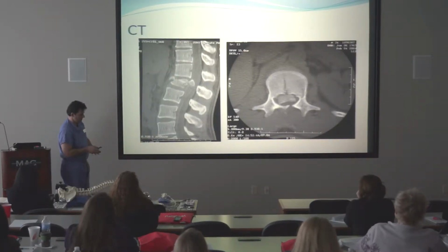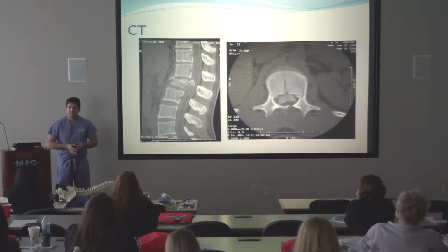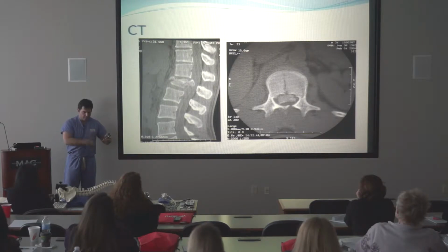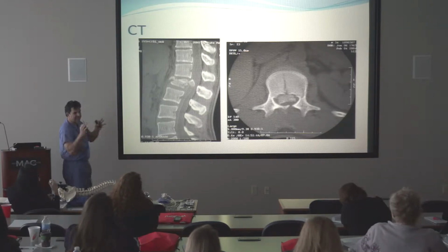Here's a CT scan. And then in addition to that, part I forgot to tell you is it works like a bread slicer. So there's vertical slices it's taking through you and then horizontal slices through you so you can get better details as far as looking at those fine cuts. So now you can clearly see the bones very, very clear. They're not this hazy whitish fog that you see on an x-ray. You can actually make the actual distinct borders out.